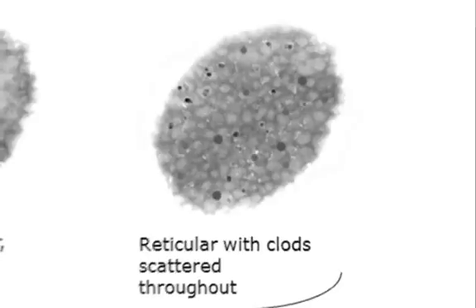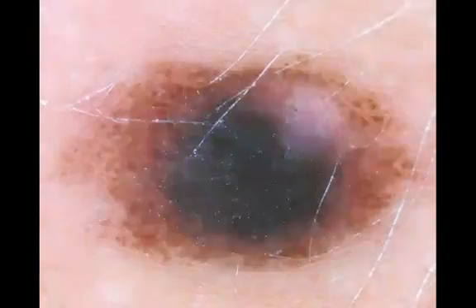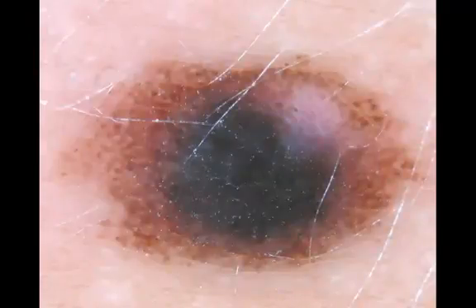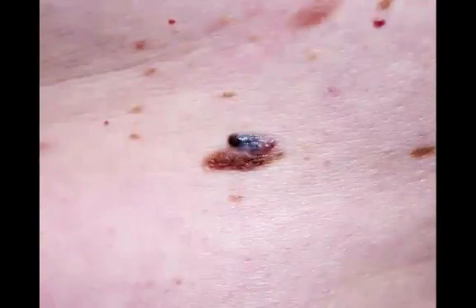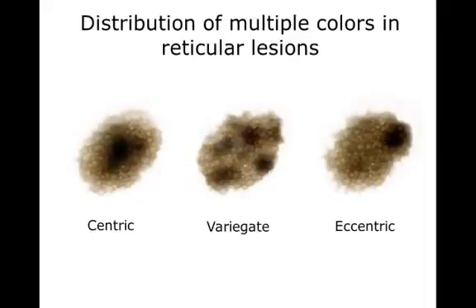All other combinations of any two patterns are asymmetrical. If there is an asymmetric arrangement of patterns, we call it chaotic. Here is an example clinically. Dermatoscopically, you can see two patterns, clods at the periphery and structureless in the center. It's symmetric. Here is another lesion clinically. Dermatoscopically, you can see two patterns, reticular lines and structureless. The structureless part has multiple colors, but it's one pattern. And the two patterns, reticular lines and structureless, are combined asymmetrically. It's chaotic.